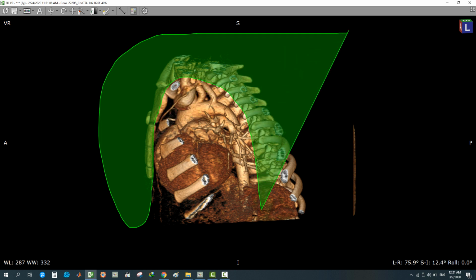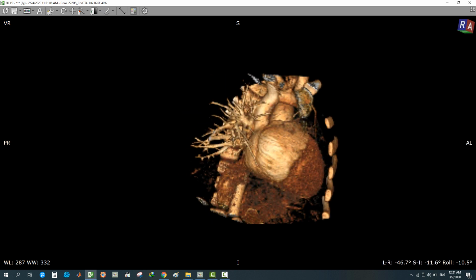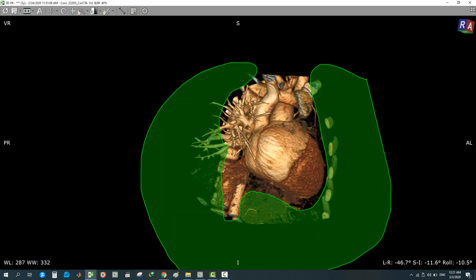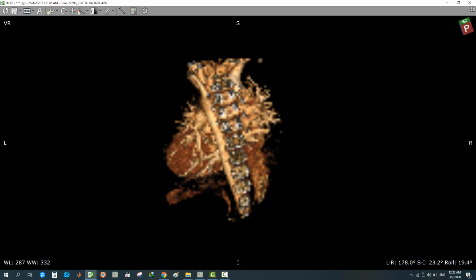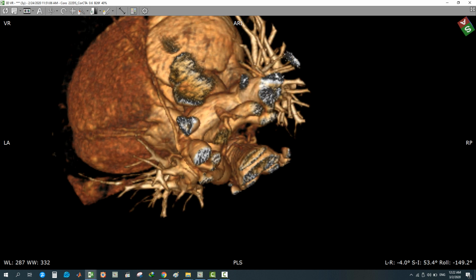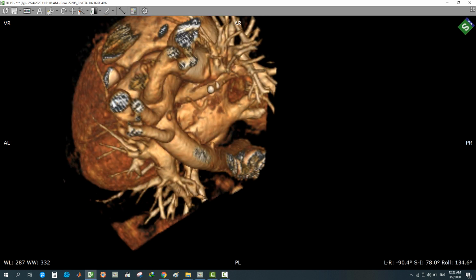Delete again like this. And you can move like this or in this fashion, to delete, but be sure that if there is MAPCAs, you will not make injury to MAPCAs.